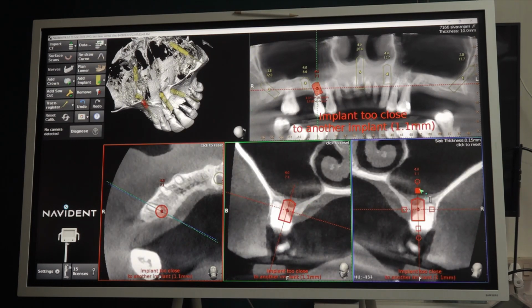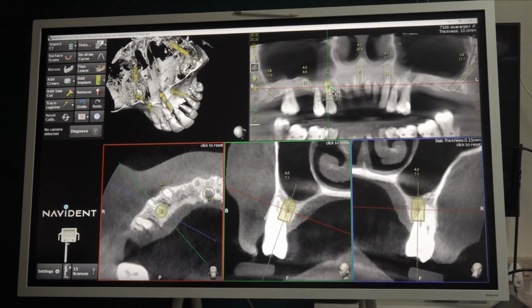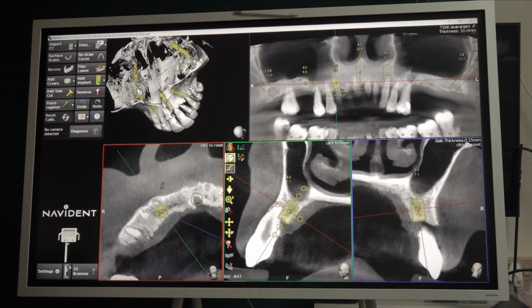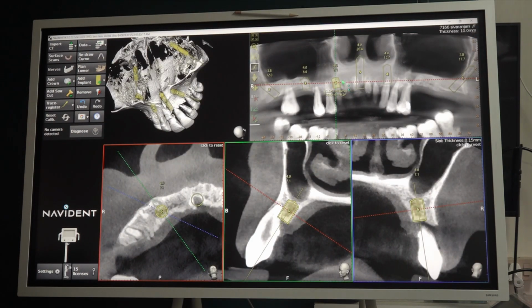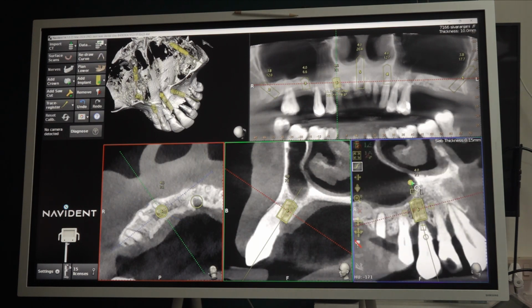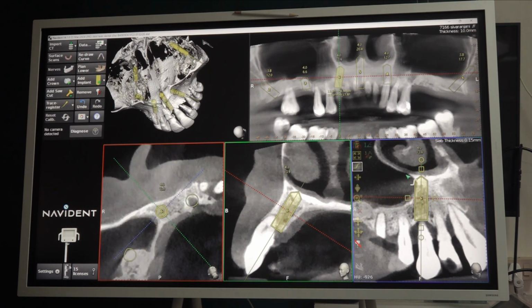This is 5. There is no bone. Do you need an expert to say that there is no bone? No. Right? In 4 also no bone. In 3 also no bone. Okay, see the sinus, how ruthlessly it has come down and complicating everything. Now from the canine we will be tilting slightly, easily. Now we are saved.